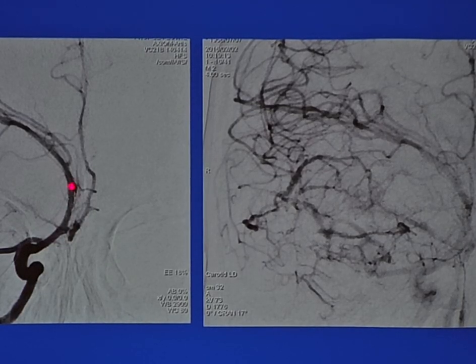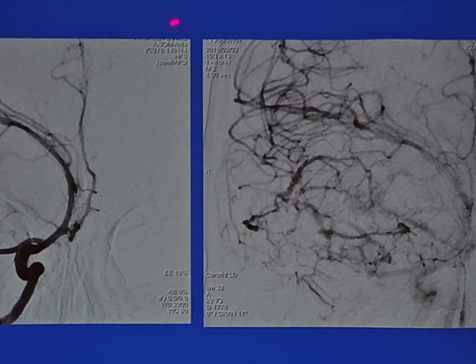Let's start. What's this? That's the easy one. Okay, we'll make it easier. What's this one? Is that what's in the midline? Thank you. It's the anterior cerebral artery. So if this one's the ACA, what's this one? It's the MCA. And of course it's stretched and it's elevated because there's a big tumor underneath it.